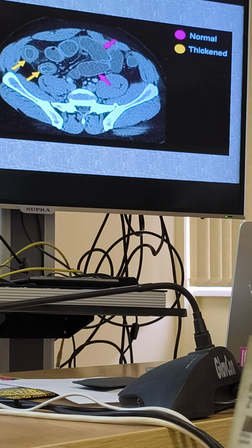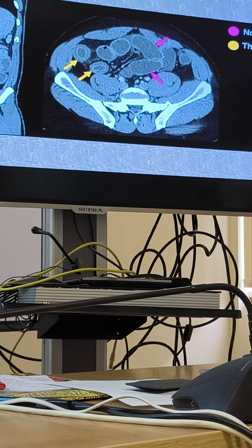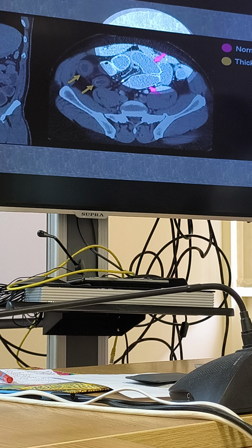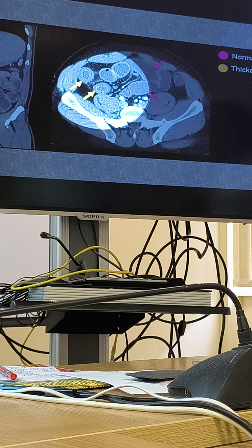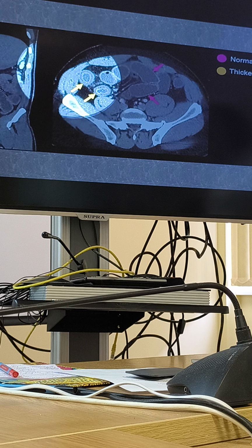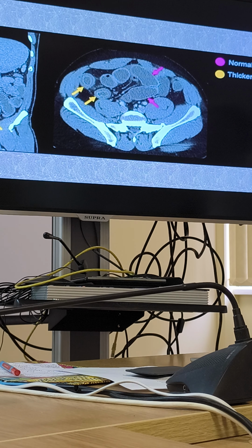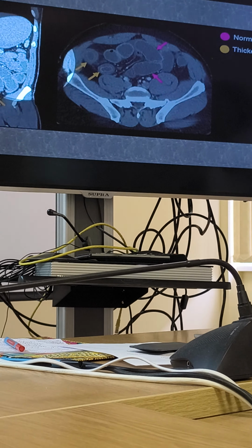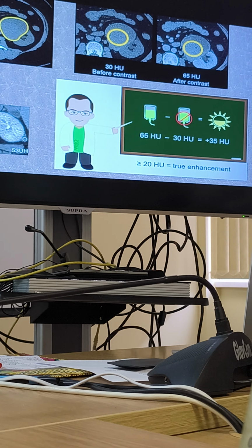And if you look at bowel with inflammation, it's the same interesting thing. So this is normal bowel, normal intestines. They are just a white thin wall, and this is inflammation. In this situation, we see thick bowel, and it's enhancing. So ischemia looks like this, and inflammation in bowel looks like this. So this is really different, and we can recognize this.